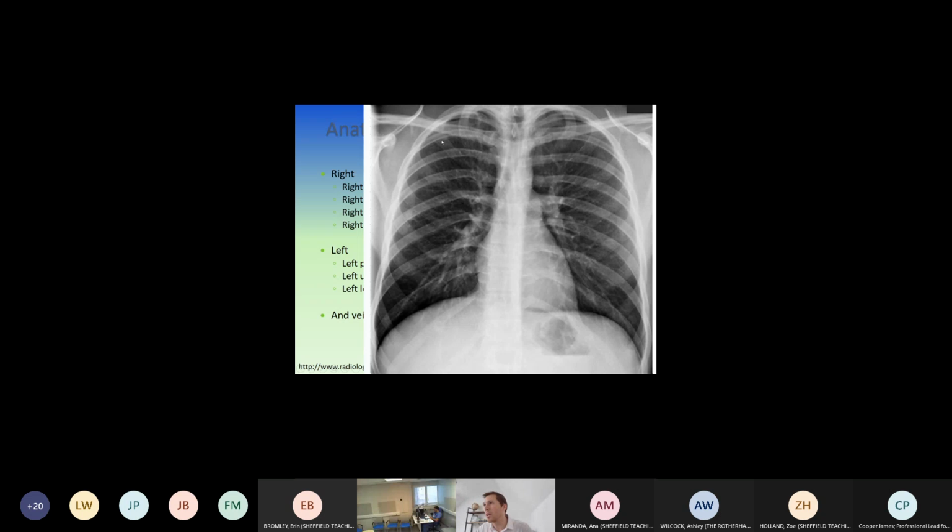The next thing, I just quickly scan through the lungs, and this is what I do with my eye. I'm just going backwards and forwards, and I'm just checking that everything in those lungs is a blood vessel. You start to see little densities, these little white densities. All these are blood vessels seen end on, so they're either coming towards you or moving away from you. Remember, we're looking at a 3D structure on a 2D image, so I don't want to see anything other than things that I can characterize definitely as blood vessels.